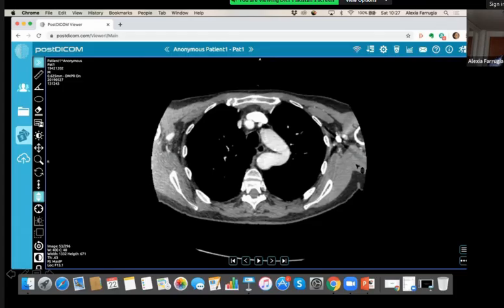Okay. So, well done. We did decipher it in the end. These patients would need further investigation to actually prove that there is an absence of pressure differences between the upper and lower extremities. And we didn't see any rib notching on the chest X-ray. This variant is important because the treatment for this is entirely conservative.